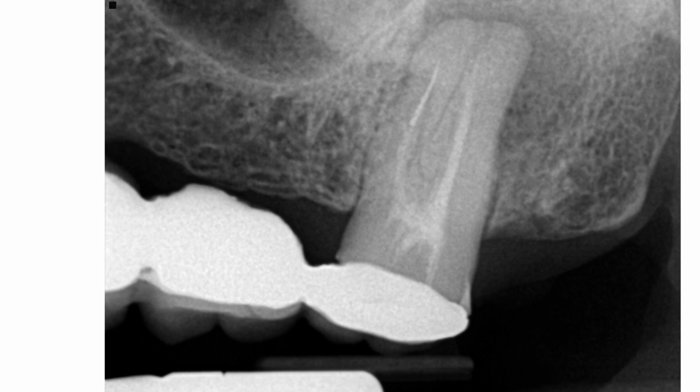So I have a really interesting case that's going to show you a drastic difference of its appearance on a two-dimensional image versus the three-dimensional CBCT scan. As we look at this endodontically treated tooth number 15, how would you assess the bone loss or the apical radiolucency? Try to draw the extent of that radiolucency as best as you can in your head. Like, how would you draw it?